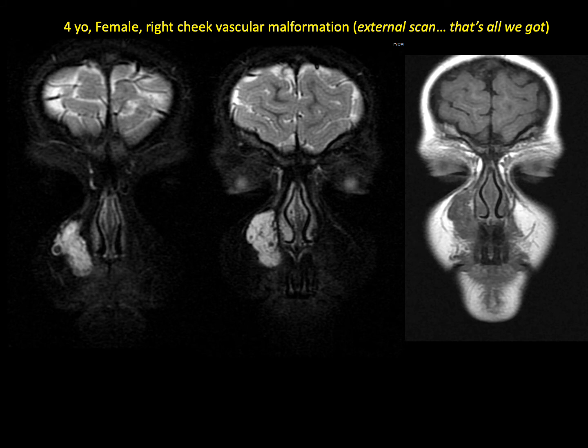But when it comes to T1 pre-contrast, so we don't give contrast, most tumors, masses, and infections will be hypointense in T1. So in this case, the spontaneous hyperintense signal that we see in T1 can be helpful because we use T1 as a passive contrast to delineate the lesion.